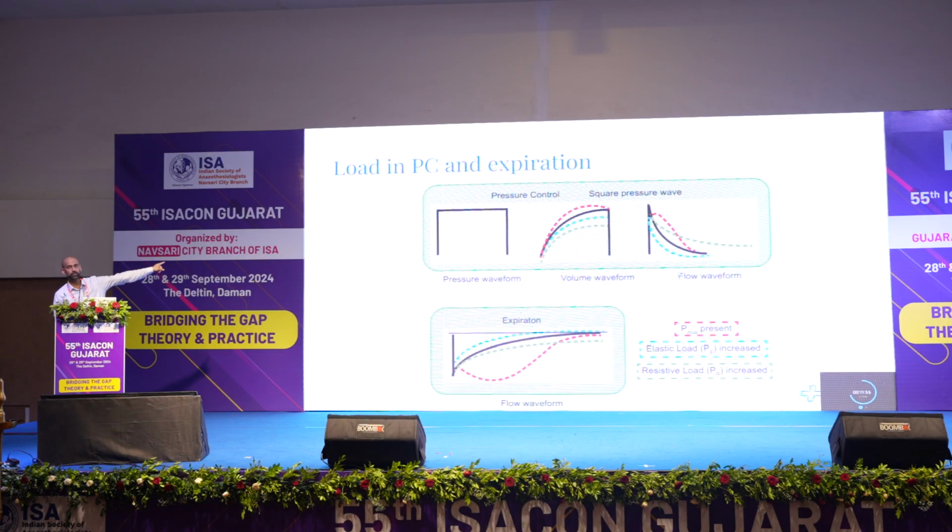What happens is the pressure waveform is fixed, so it will show a rectangular or a square shape. Therefore, the dependent variable, all the changes that I showed you in the previous slide, you need to train yourself to see on the flow time waveform. And we'll do practice on this. Similarly, on expiration, both in VC and PC, expiration is passive, so only one graph is enough for the template. And any trainee, anybody who is seasoned can use this for further classification.